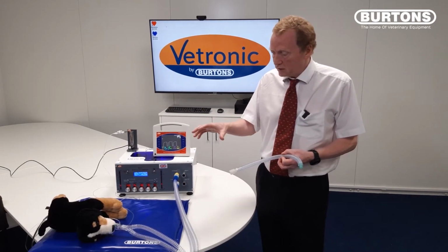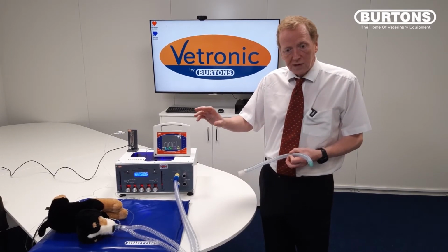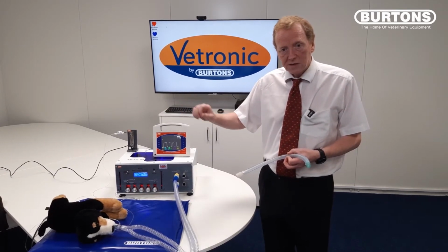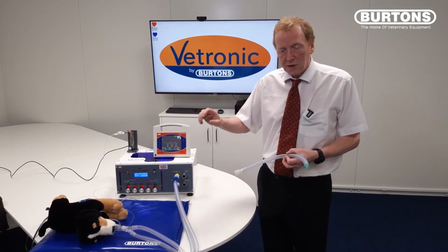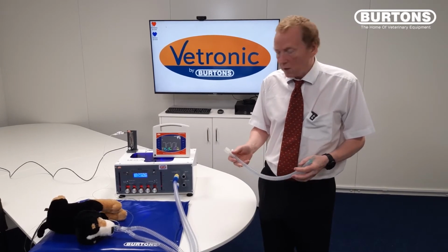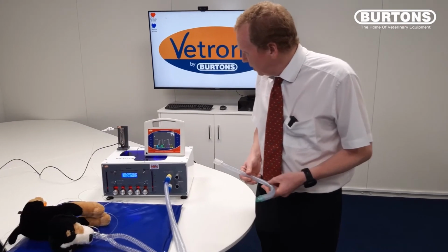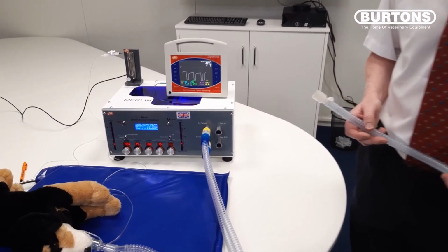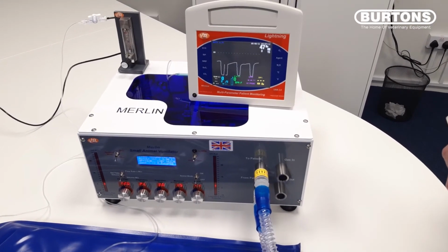So I'm going to introduce this into the patient airway from the point of the Y-piece down to the patient, where this will be true extra apparatus dead space, and we'd expect to see a rise in the end tidal CO2. So we'll do that now, and we'll keep an eye on the end tidal CO2. At the moment, we've got a nice steady value of about 44-45 millimetres of mercury, which is normocapnia, and I'm going to introduce the dead space now.